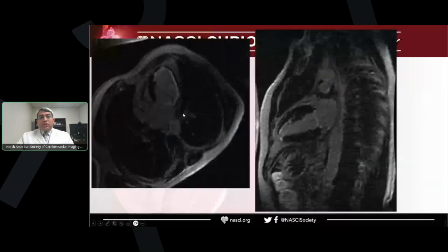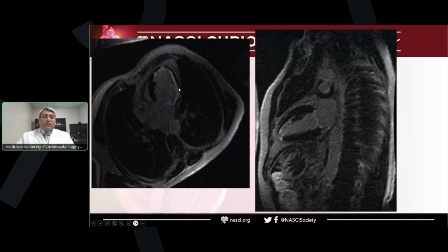And this patient, probably it could be the same patient we presented the image of at the beginning. So this patient we see here, subendocardial enhancement along the anterior wall and lateral, almost transmural along the LCX territory lateral wall.